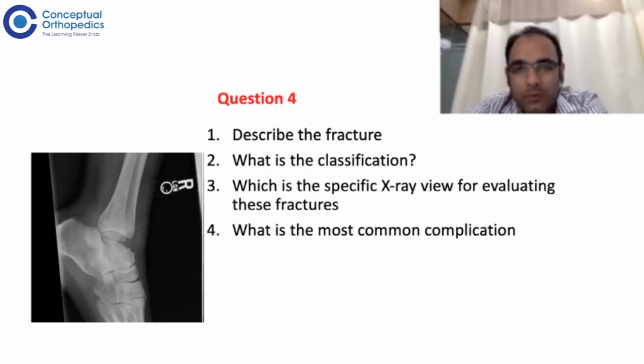When we talk about the specific X-ray view for evaluating talar neck fractures, or any pathology in the talar neck, it is the Canale and Kelly view.